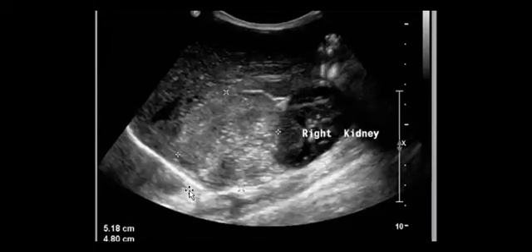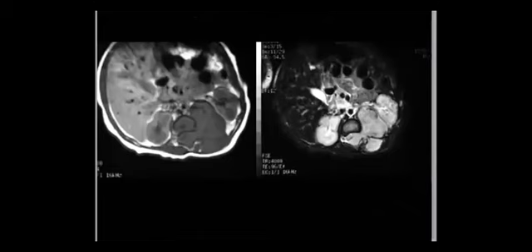And when you do ultrasound, it is much easier to mention that it is neuroblastoma, and you can see the kidney and the appearance of the adrenal, how it looks. In the MRI it is much easier, as we mentioned before. So don't forget neuroblastoma. And when you check the bones, you are going to check the metastatic appearance of the bones.